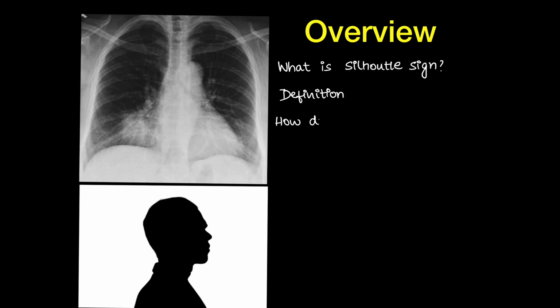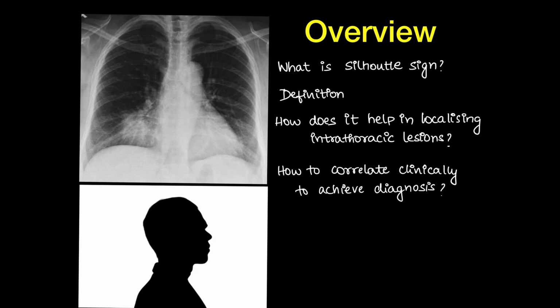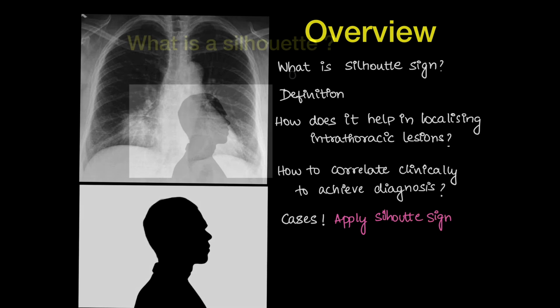Its actual verbatim definition. How does it help in localizing intrathoracic lesions? How to correlate the silhouette sign clinically to achieve diagnosis on a chest x-ray. Lastly, we'll see some interesting cases where we apply the silhouette sign.